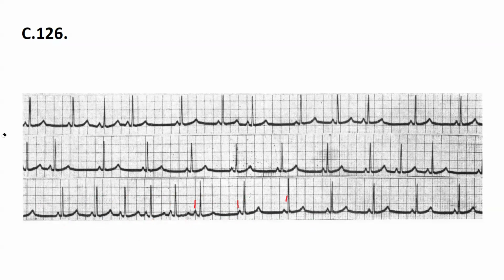Let's go for this interval that you can see here. This is the normal PQRS. Here there is no P. We do see this is very similar to the previous one. That's an SA block. But now you have to look at this distance and compare it to this one.